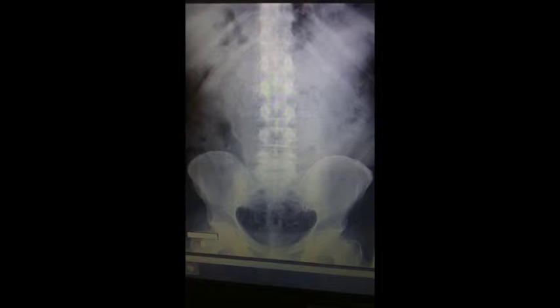We have soft tissue brightness and contrast, and that shows by the lateral abdominal wall and the peritoneal fat layer. We need to see the psoas muscles, the lower border of the liver and kidneys, the inferior ribs, the transverse processes of the lumbar vertebrae, and the correct marker on the right side and not overlapping the abdominal contents.